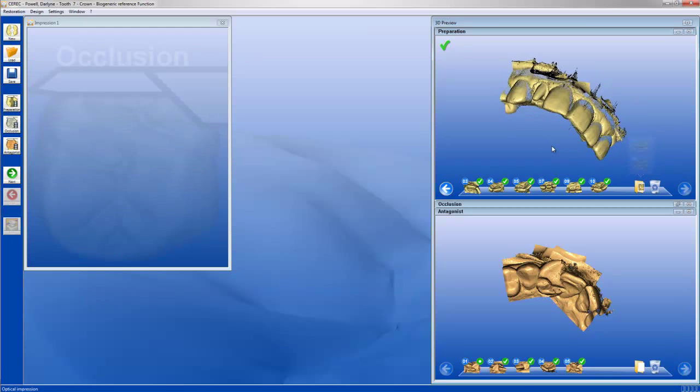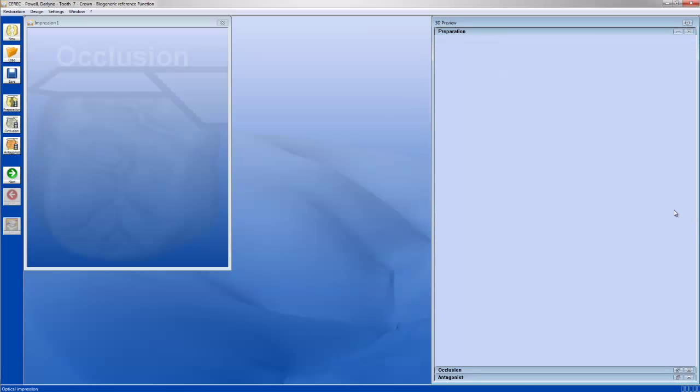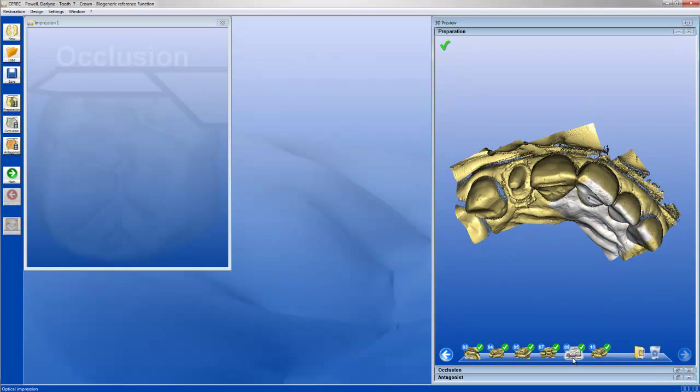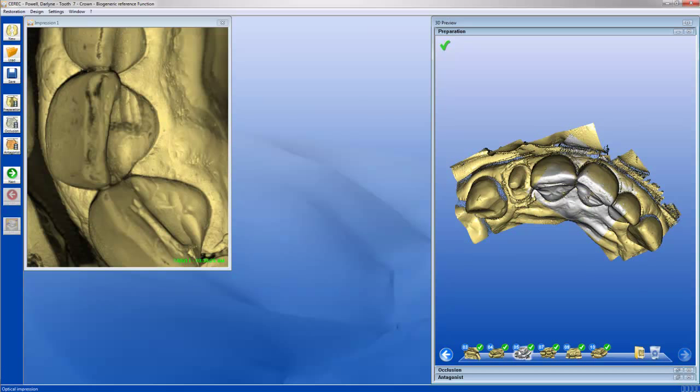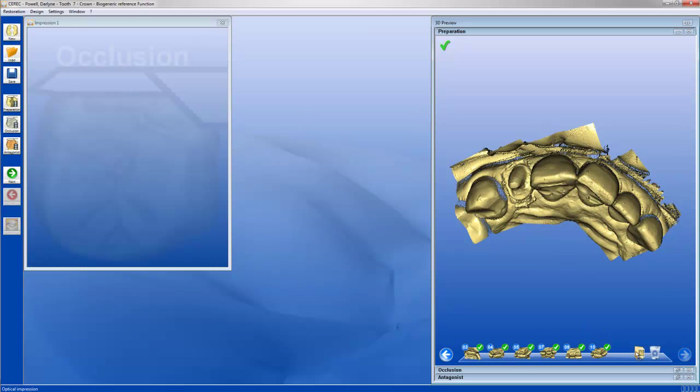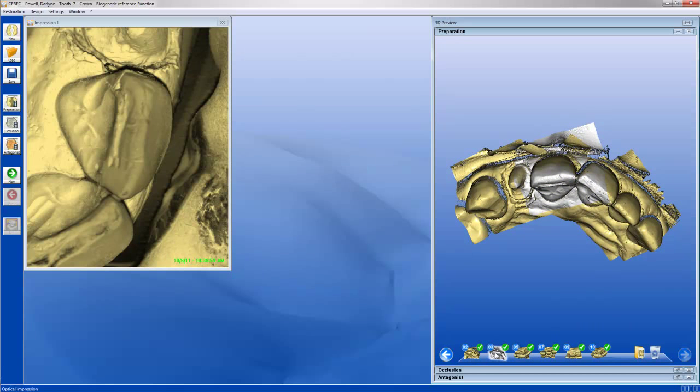Ideally, I would have liked to have gotten rid of a little bit more, but look at how much cleaner this looks over here. A lot of that distortion is already gone, and if we can go in and get rid of some of these other ones, we might be able to clean up this model even more. Let's see if I can get rid of image number 4. Good. The fewer images I have, the better off we are.